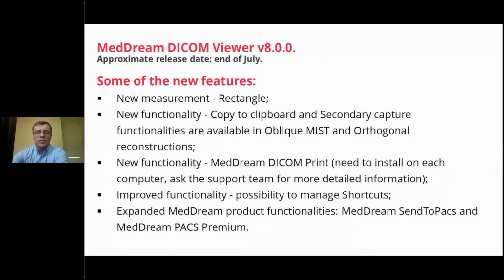This is very significant, because until now our users were not able to save MPR images in any form for later review, so we always needed to recreate MPR 3D selections to see the data. With this secondary capture function, you will be able to create an MPR, put in measurements and annotations, and save them as additional secondary capture images. This will save a lot of time for your colleagues who review the data after you.